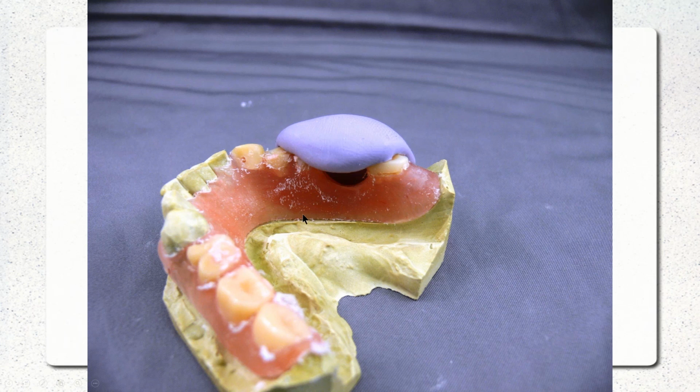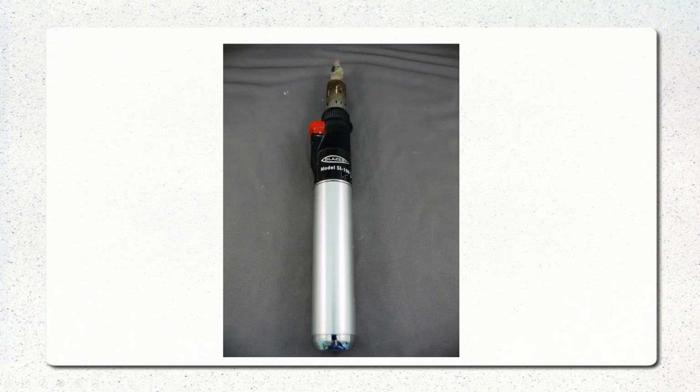This little torch here is really, really nice. It's made by Blazer. It's model number SI100, and it just blows hot air out the nozzle. There's no flame that comes out, it runs off of butane. The flame is kind of down in the base, and just hot air comes out the nozzle. So for repairing, or even doing some polishing, the little hairs that develop in areas, whether it's Duraflex or VisiClear, you can hit them and they just melt away to nothing. So it's a really handy torch and very cost effective.